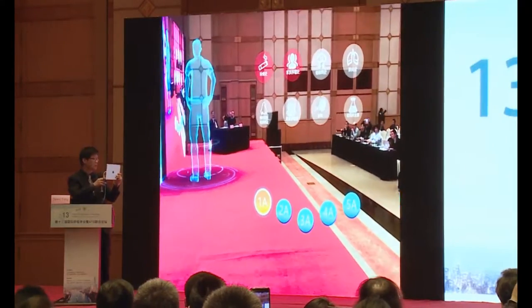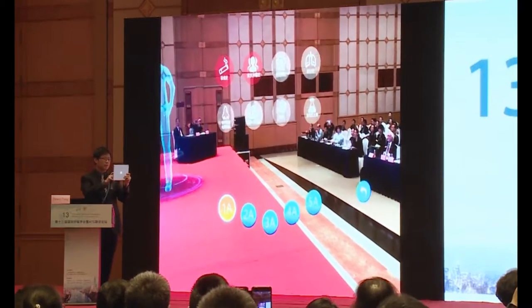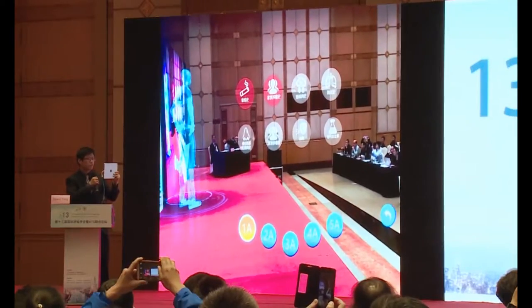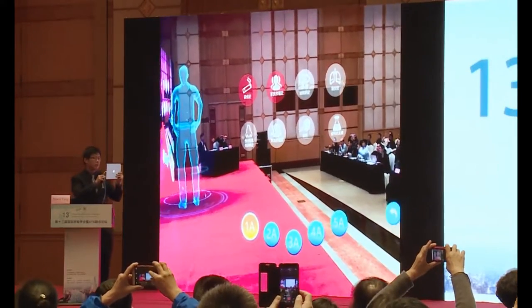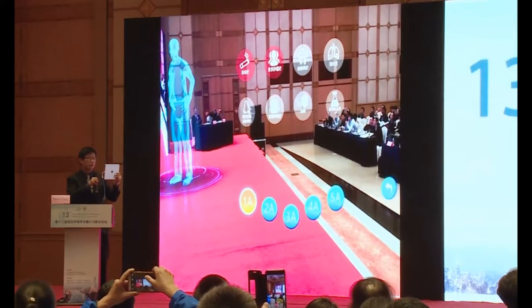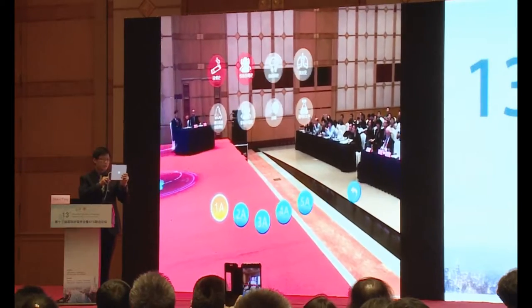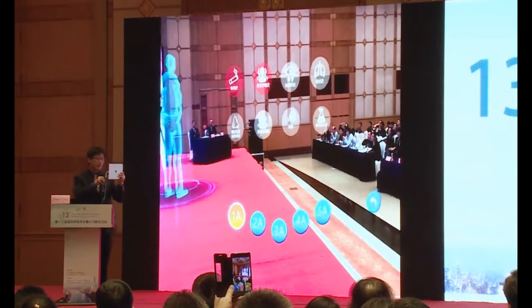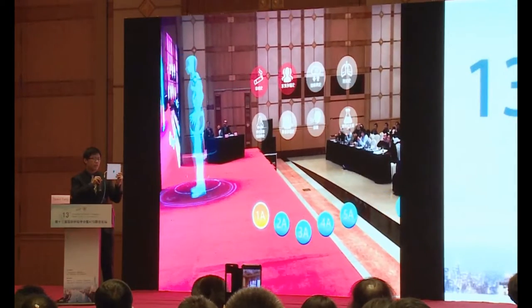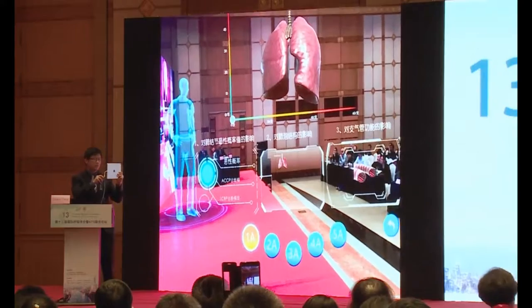We have the 5 steps of A here, and that's just fixed on the platform. So first we see the first A. On the first A we will collect some clinical data, including the smoking history, the history of cancer, the TB history, the inflammation. Pneumonia is very important in China, and chronic disease like COPD, and the family history of cancer, and even the cough and antibiotics use history. So first we see the smoking history.